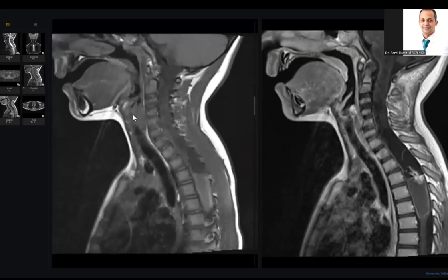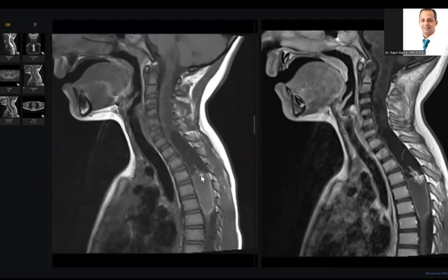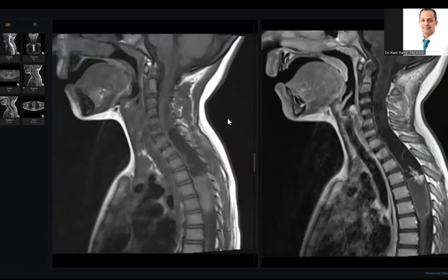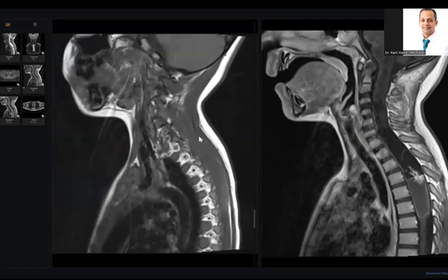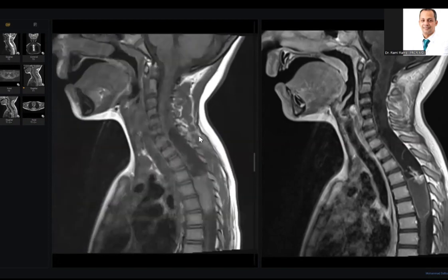If I told you this is T1, and this is high, what else? This could be a hemorrhagic component. Especially you feel that there are some levels here. There are levels. So what do you think? It could be a fat component, but it's usually not common. If this is a fat component, what do you think? Give me a differential diagnosis.